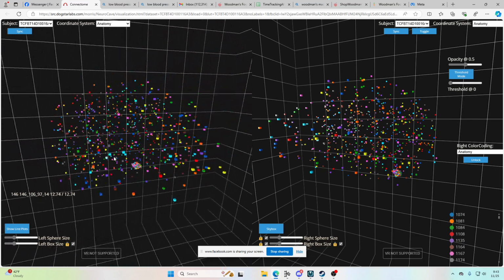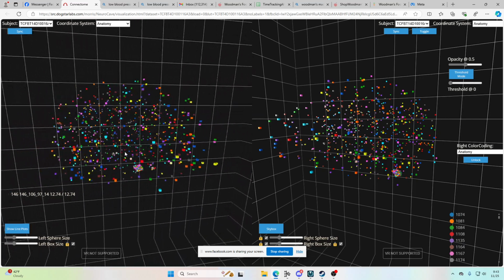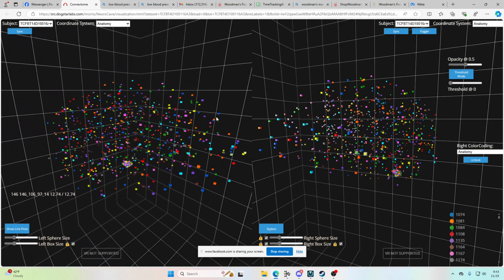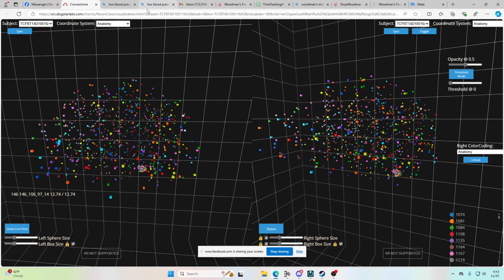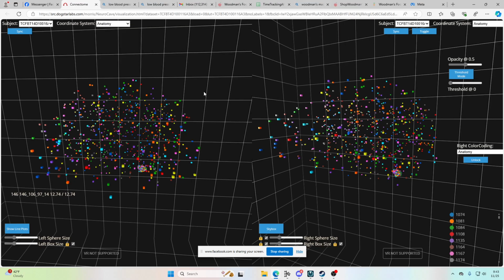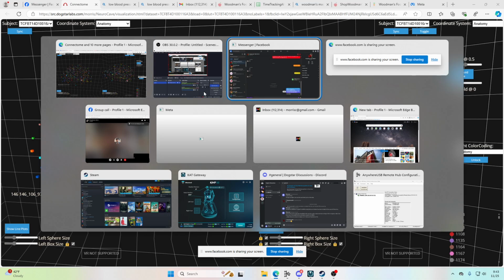Yeah. So this is the latest data set I've been trying to import into my visual analytics platform. It's from the BraTS competition. Let's see. What do we know about the BraTS competition? I think I sent a link to it on our Facebook chat.